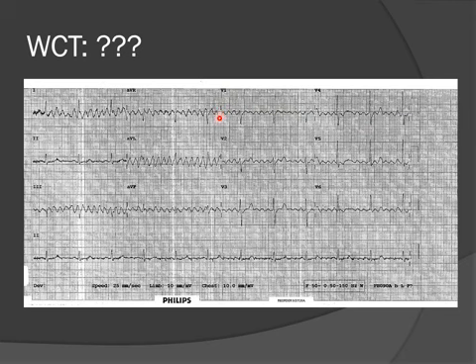I think the giveaway, though, is look down at lead 2. Remember to always start with the rhythm strip. We have regular QRS complexes. If you go up from your QRS complexes, remember this is time, we can see QRS complexes within that other funny looking rhythm. There are definite P waves here, so our underlying rhythm is sinus. This is a shiver artifact from a very cold patient. But you can imagine if you were monitoring the patient on AVL, for example, only, you could get quite confused. It's always important to go and talk to your patient when you see an abnormal rhythm, though, before you leap into action.